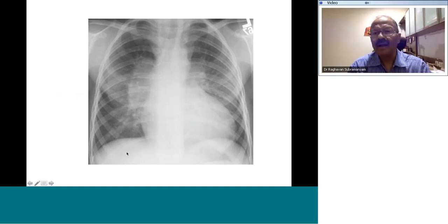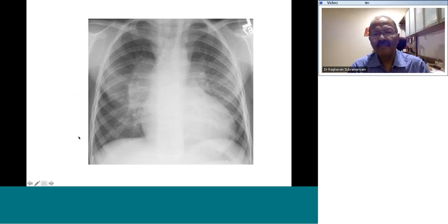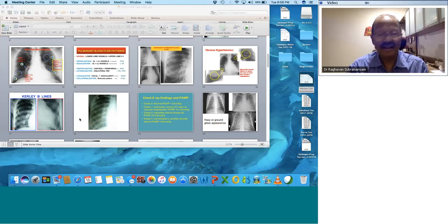Sorry. Yes. Can you see my X-ray here? Okay. Yes. Anybody? Okay. This X-ray. Sorry. I'll come back to that again.